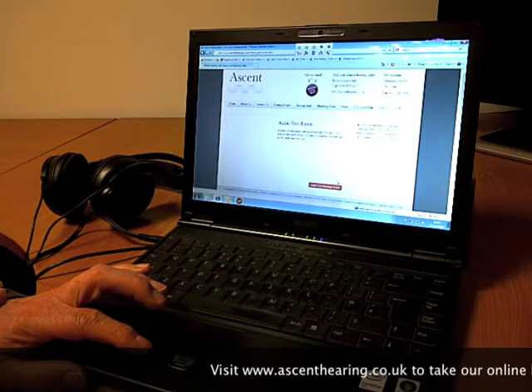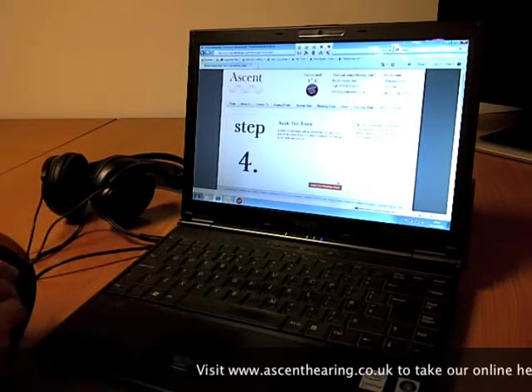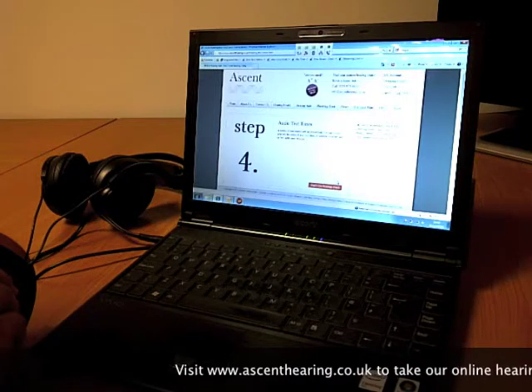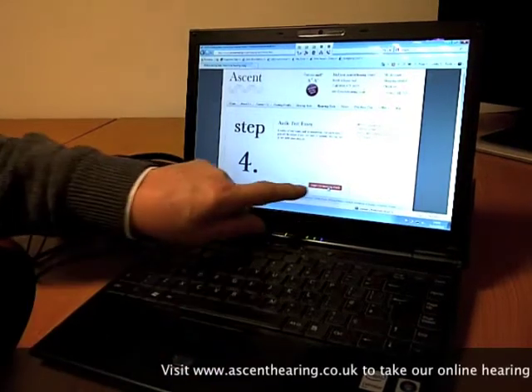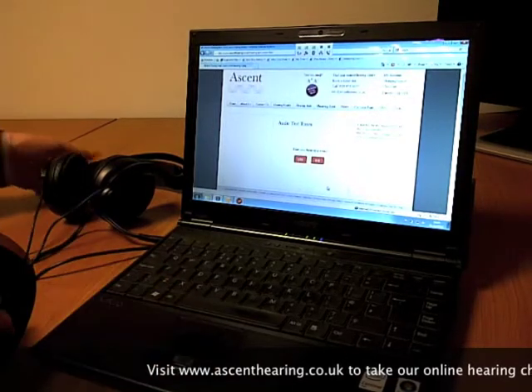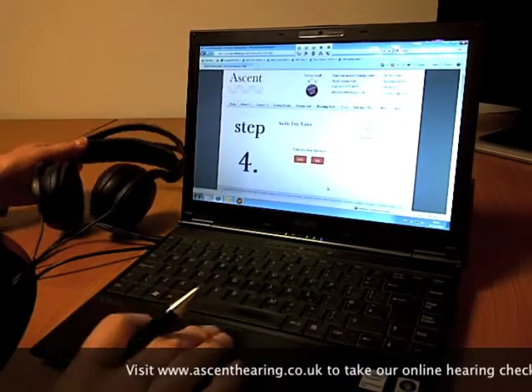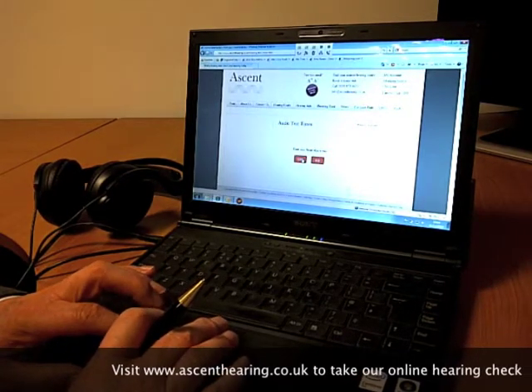And now all we're going to do is listen to a series of signals in our right ear, in our left ear, and we just have to click whether we hear them or not. If we hear the signal, we click we've heard it. If we don't hear the signal, we click we haven't heard it. So to begin the test, I click begin the test, very technical, and I'm now being presented with a signal in my right ear, and I have to indicate whether I can hear that or not. Well, actually, I'll click yes, I can hear that particular tone.